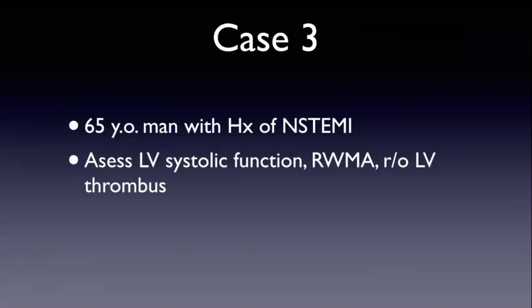Case 3. So, a 65-year-old man, history of NSTEMI, non-ST-segment elevation myocardial infarction. Once again, assess LV systolic function, wall motion abnormalities, and rule out LV thrombus.